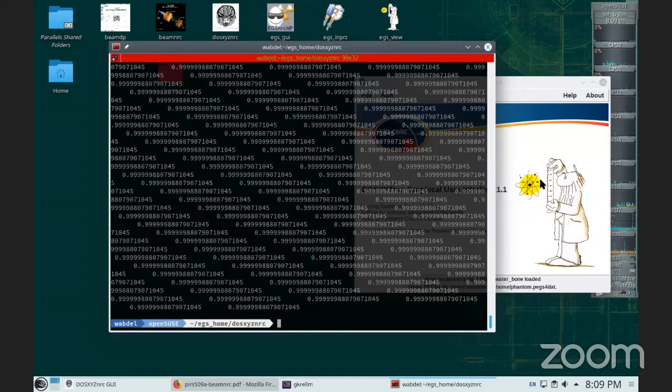The dose XYZ show, I don't think it reads the DICOM RT structure. It does not read that. This phantom is generated from dose XYZ. Okay, but that is later on.